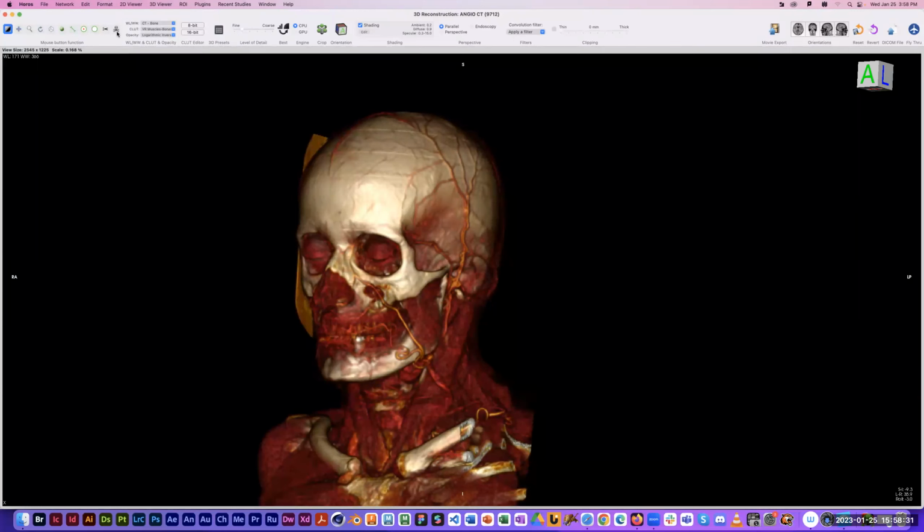This is supposed to remove bones. So theoretically, I should be able to grab that skull and crossbone tool and click on his skull, and it will remove the skull and leave everything else.